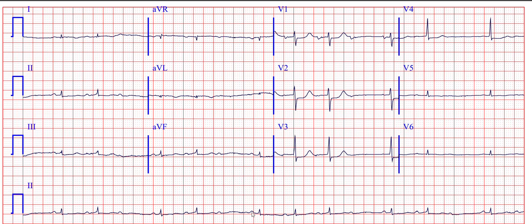But here you can see the PR interval is prolonged, this is more prolonged, then this is dropped. So here it is 1, 2, 3, 4, 4 is to 3 Wenckebach phenomenon. So there is 3 is to 2 Wenckebach phenomenon and 4 is to 3 Wenckebach phenomenon.